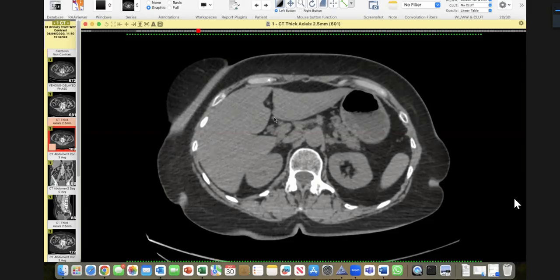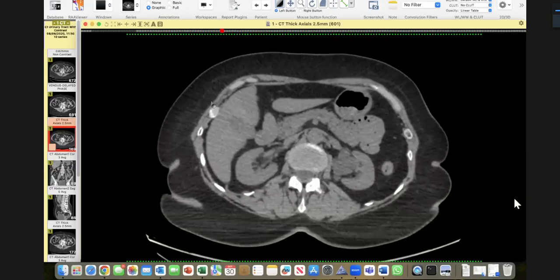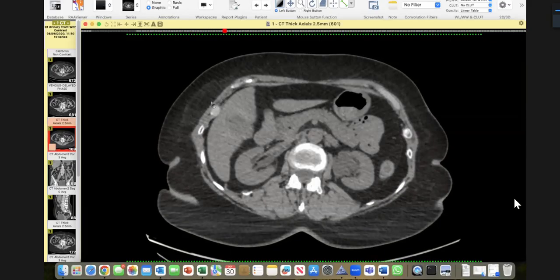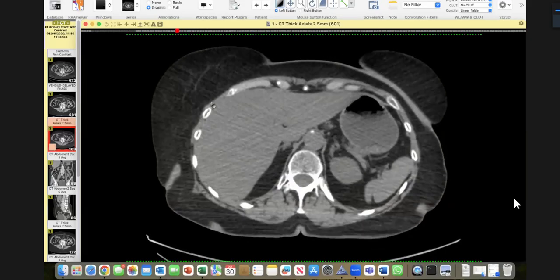Okay. I requested. Yeah. It's not, no. Yeah, it's scrolling now. I think, yeah. I want you to concentrate on the kidneys.